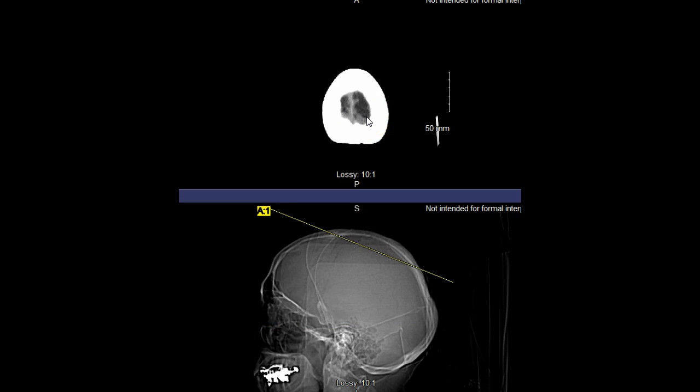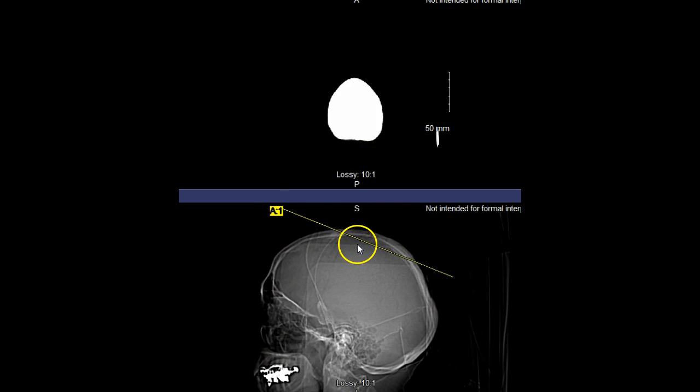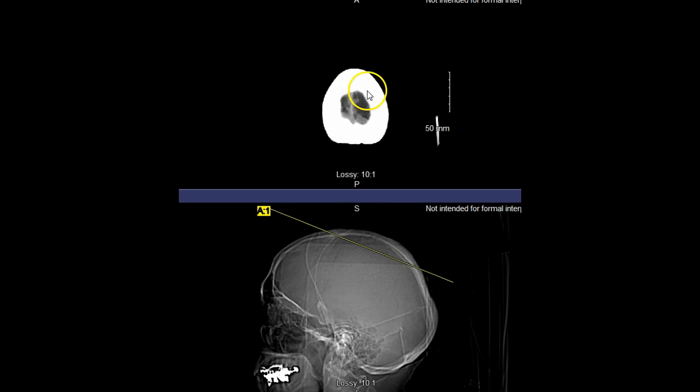So looking at the image, you can see we're at the superior aspect of the skull, really near the parietal vertex, or the vertex of the skull. So through the parietal bones is what you're visualizing there at the top. I think the graphic here will really help as it goes through. We can definitely tell that we're in an oblique orientation. Again, to save dose to the lens, that's the appropriate orientation to go through the head.